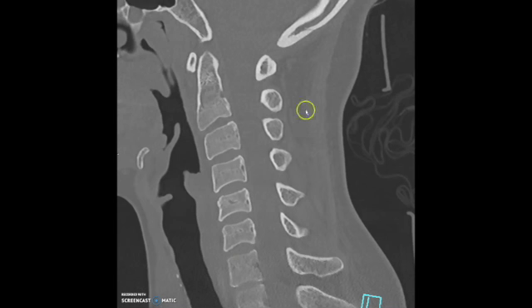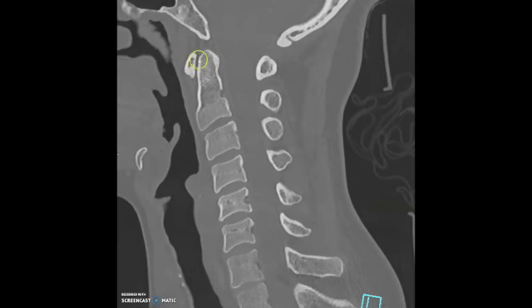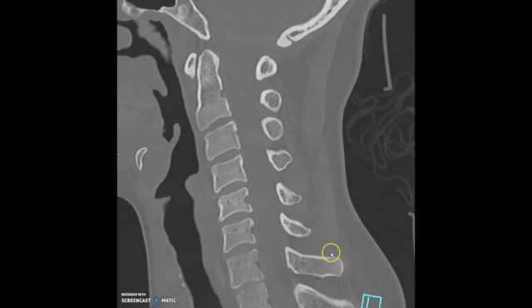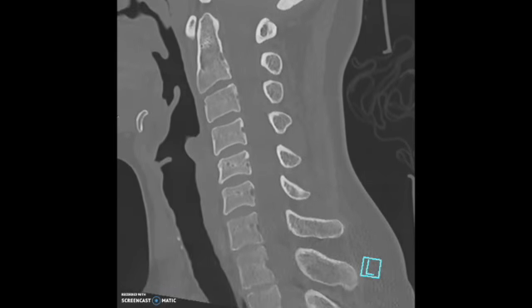So here's the different patient. Again, cervical alignment, it's straightened. But if you look here at C1, here's a spinous process, C2, spinous process, C3, C4, C5, C6, and you'll see that at C7 there's a change. The spinous process looks more like a thoracic spinous process, and then that tells you C7, and then the next one below that is, sorry, let me move that down, is T1.